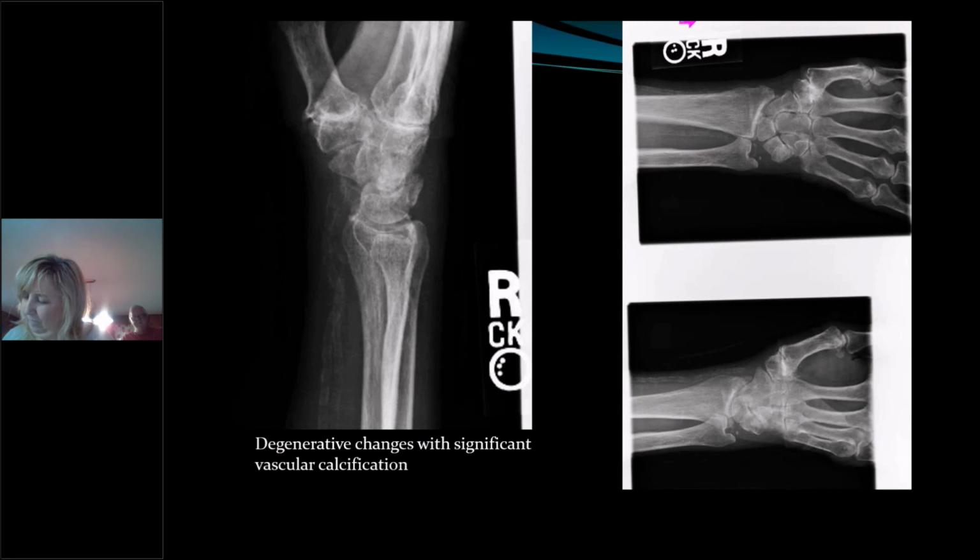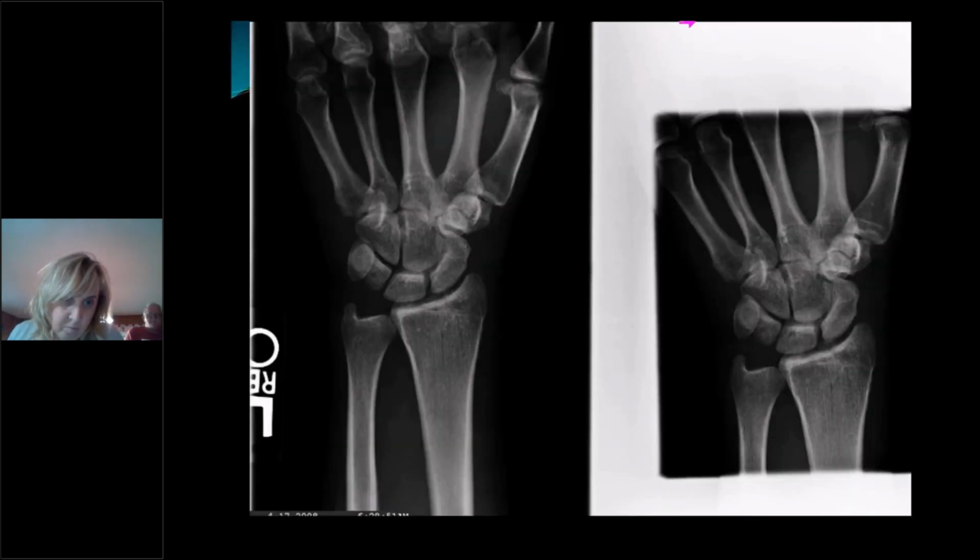It's an interesting x-ray. I wanted to show you guys that this patient actually has more calcium and crud in their pipes, their radial and ulnar arteries, than they actually do. The patient has significant osteopenia. You see all that, the bone is really crummy. So this person is obviously high risk for fracture and MI, because they've got horrible pipes and horrible bones. So just a couple things that you can see on x-ray besides fractures.